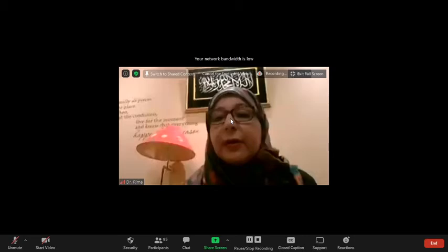Mainly, tetralogy of Fallot is easy to diagnose, but if you only do the four-chamber view, you can miss it, and this is how colleagues miss the diagnosis if they are in a hurry. If you do the long axis, then you can get the pulmonary artery as well, and then you know that there's a VSD. If you don't go up to the great vessels, you will treat patients for a VSD, but in fact it's more complex.